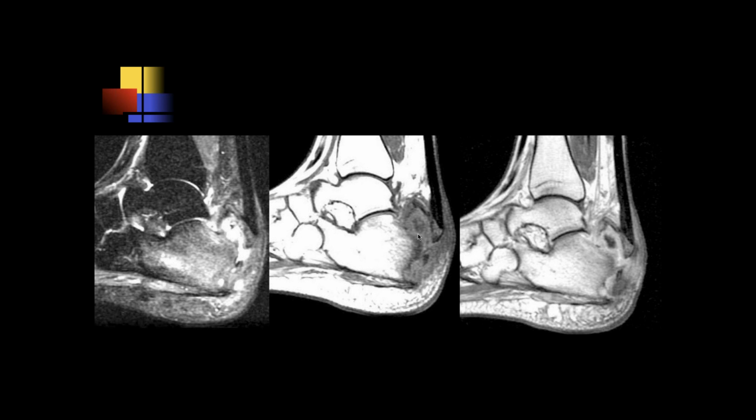Jennifer, what do you think of this case? Okay, so here it looks like there's an ossific fragment along the distal Achilles tendon. Looks like an ossific avulsion injury of the distal Achilles, and there's surrounding edema and fluid signal intensity. I don't see any discrete overlying ulcer.